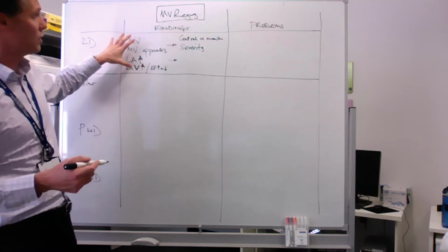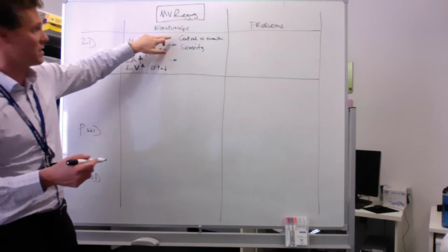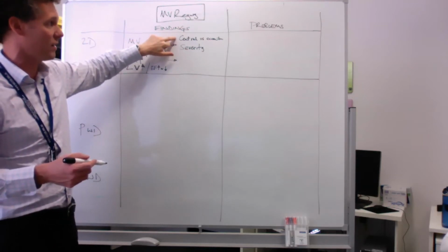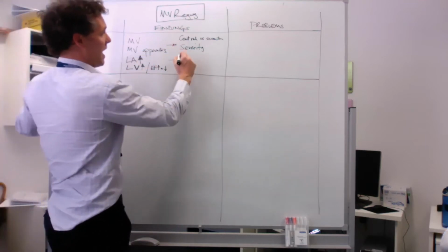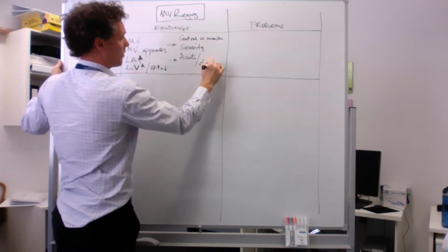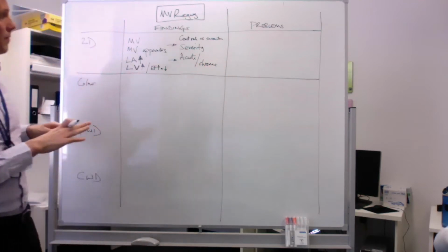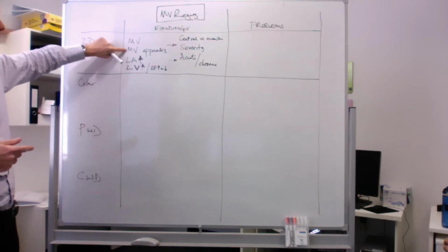So I think all of these 2D findings can help guide your assessment of the rest of it in terms of central versus eccentric. It can help tell you whether you're dealing with something that's severe, and it can help tell you acute versus chronic. Annular calcification as well. Nice, yeah, absolutely, in the mitral valve apparatus.